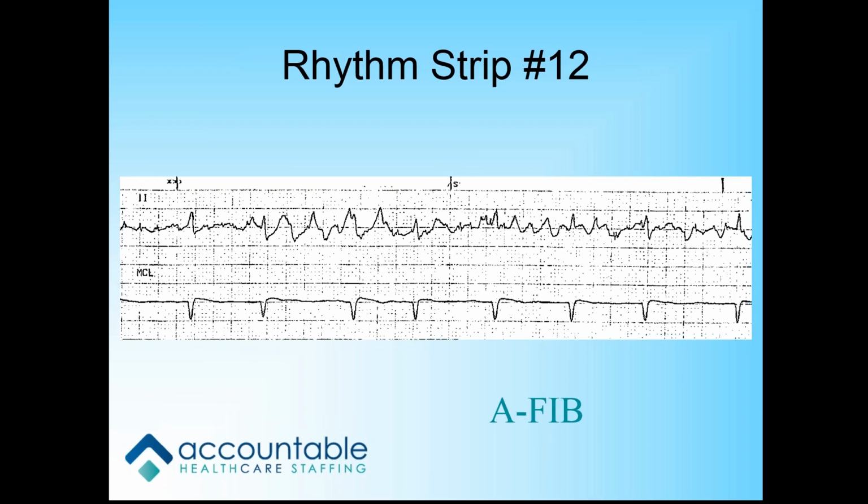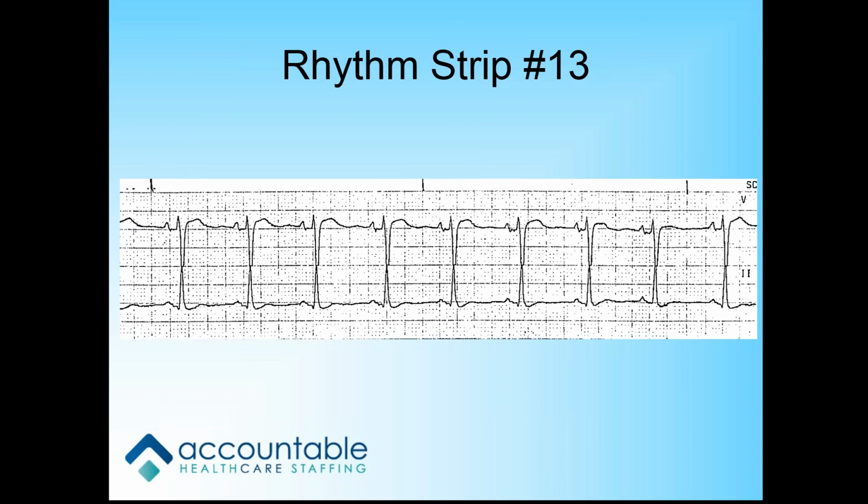Thanks. Jessica, next. Are we going to get one similar to that we just got? This is Jessica. I didn't like that one. I do not believe they have an artifact on there. I put it on there because I think it's important for you to keep that in mind. If you have 2 rhythms coming across on one strip and one is organized looking and one is not, go check your patient.